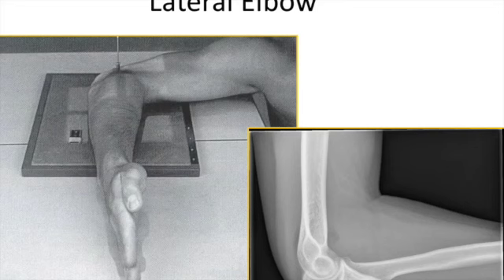This is how a lateral view of the elbow is going to be achieved. Like I've said earlier, the lateral view is going to place the elbow at about 90 degrees of flexion, and then we're going to view the elbow from the lateral to the medial side. So this is a difference that we saw with the elbow versus, say, the foot and ankle. So we definitely want to make sure we know where that x-ray beam is coming from and where that x-ray beam is going to. That's going to really determine things like attenuation and obscurity when it comes to viewing radiographic images.